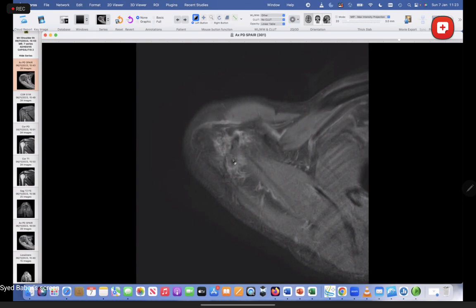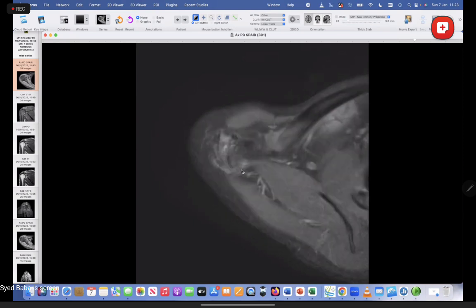And this is where you see it as a triangle, a large bone sitting as an extra ossicle. The importance of noting that is that it is one of the causes of impingement. So if you see a big os acromiale, don't ignore it. You have to mention it in your report because it may well be causing impingement. It is usually unstable and it causes the joint to be unstable, and it keeps pressing on the underlying bursa, and that causes impingement. So again, you can assess the AC joint to a certain degree, primarily to exclude an os acromiale.